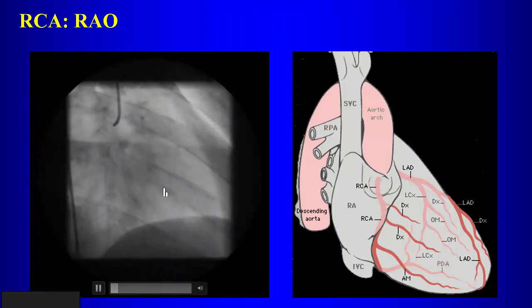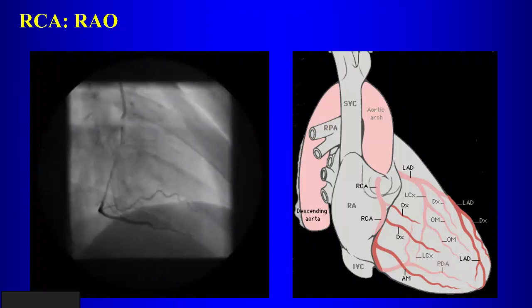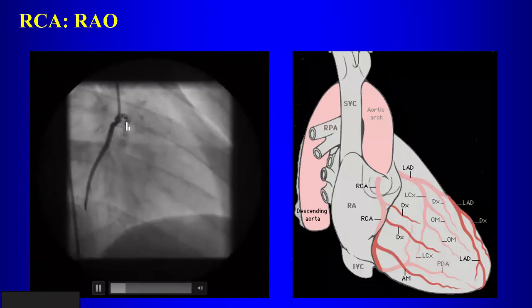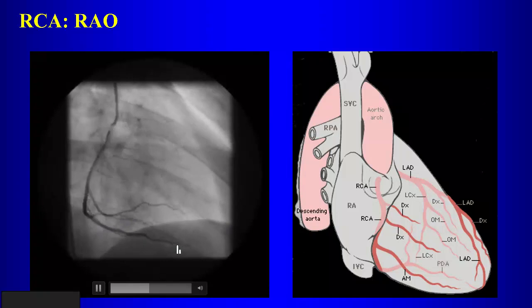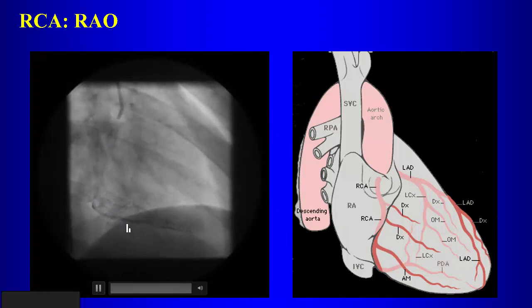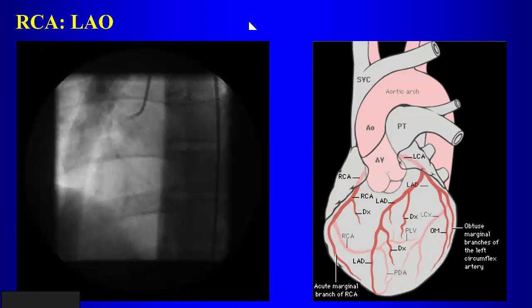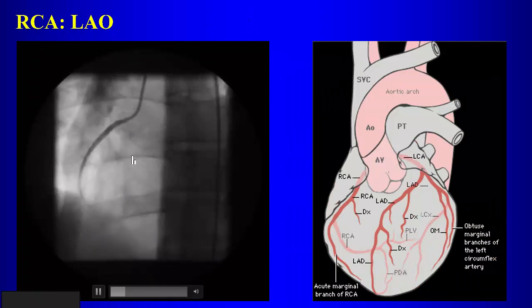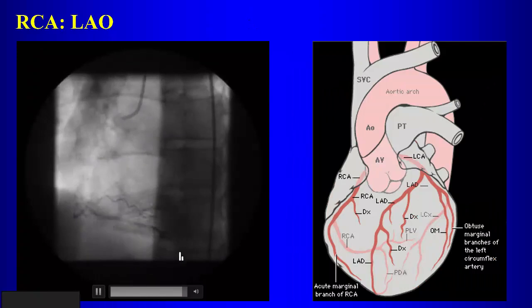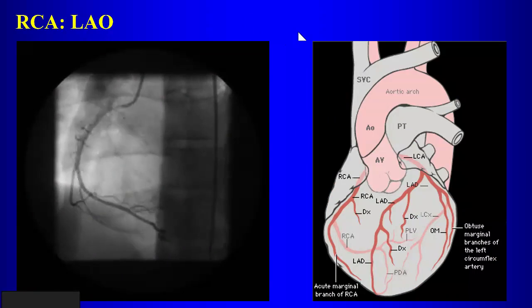Now, this anatomy you can also make out when you're looking at coronary angiograms, conventional catheter coronary angiograms. So in the right anterior oblique view, here you have the injection of the right coronary artery that's coming towards you here. And then here in profile, what vessel do we have here in profile? PDA. PDA, right, that's the right dominant system. That's the PDA down there that you have in profile. And then here in the left anterior oblique view, now you have the right coronary artery here in profile. The PDA here is shortened as it's coming towards you in this view, okay?